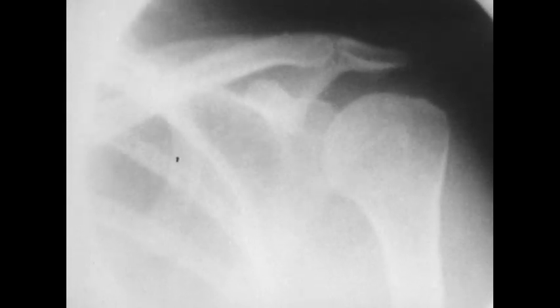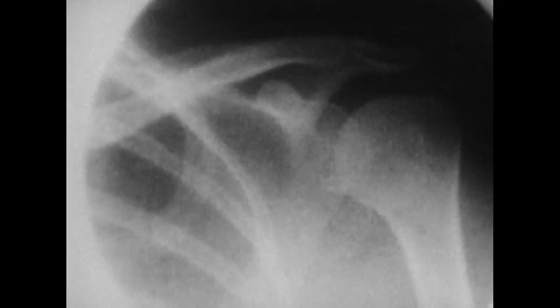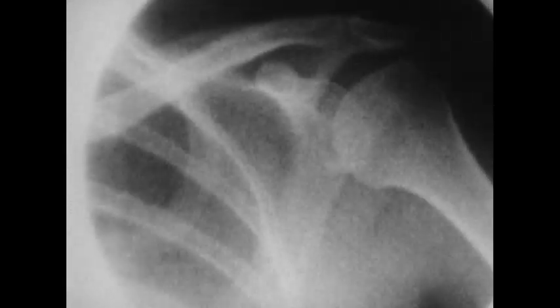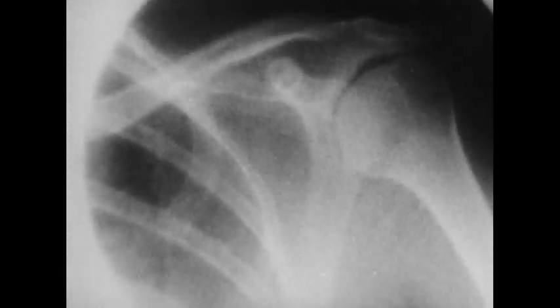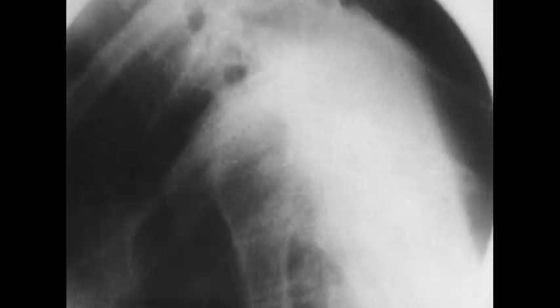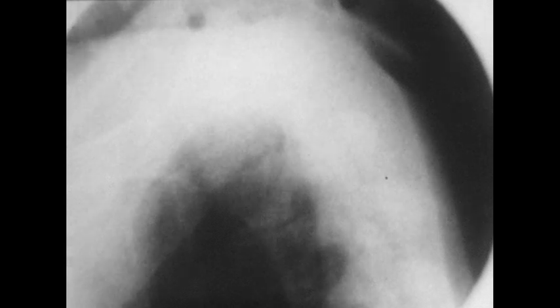The glenohumeral or shoulder joint is one of the most symmetrical and movable of all joints. A large spherical humeral head moves in a shallow concave glenoid cavity. It is a ball and socket joint with mixed gliding, rolling, and rotary movements. The head of the humerus and its loose capsule are retained in position mainly by muscles and less so by ligaments. In flexion and extension, the head of the humerus moves upon the center of the glenoid cavity.